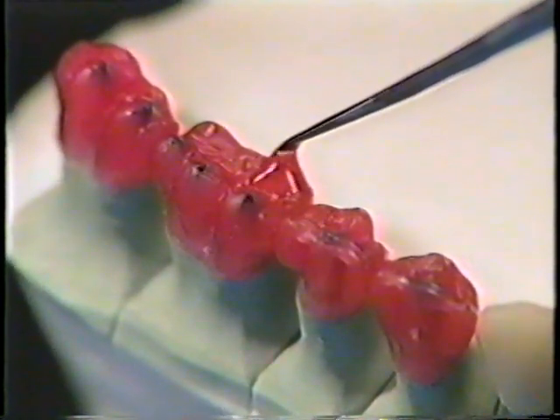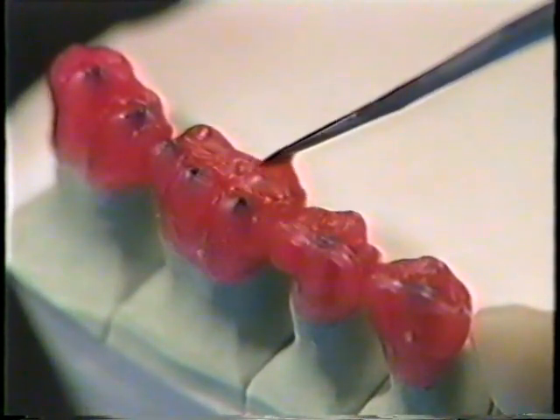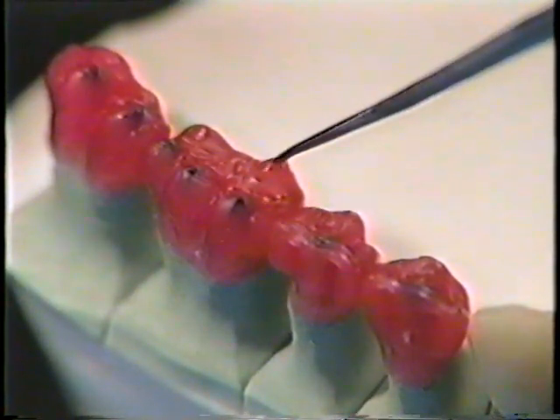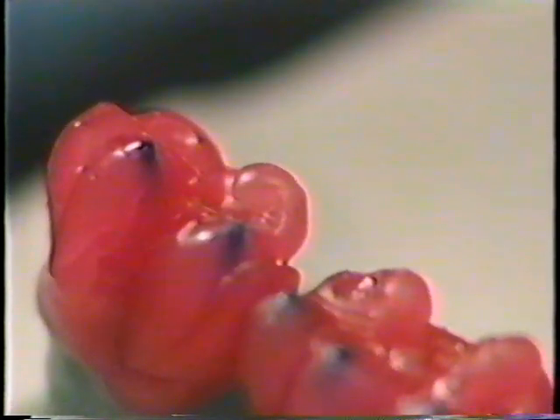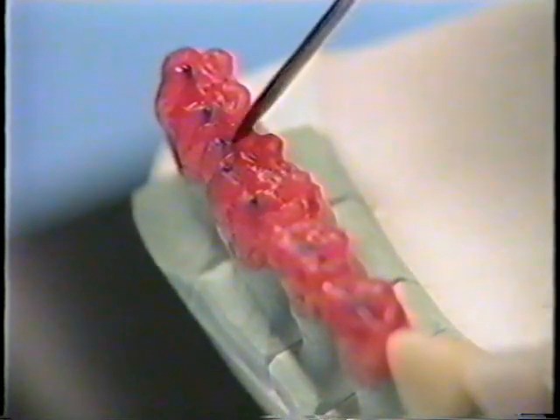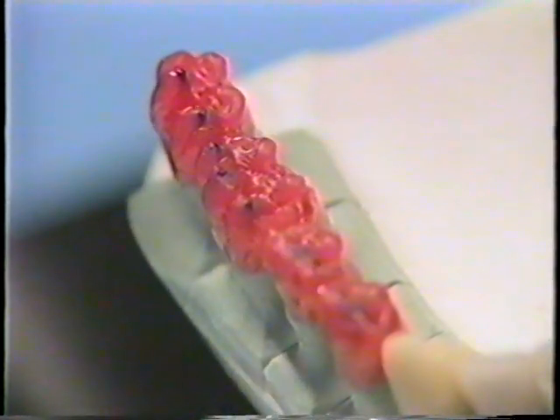Our crown design will be guided by the three-plane concept, which involves considering the distance and play between cusps, checking the occlusal relationship between each antagonist, and determining the points of the lingual cusps. Moreover, we'll be taking great pains to sculpt anatomically correct details when forming the mesial and distal cusp ridges.